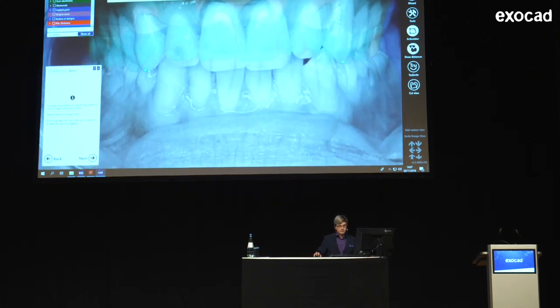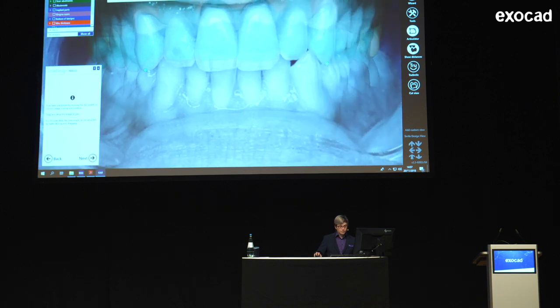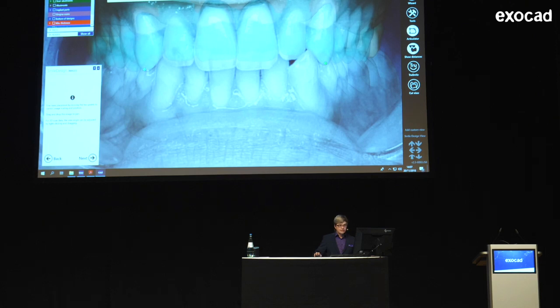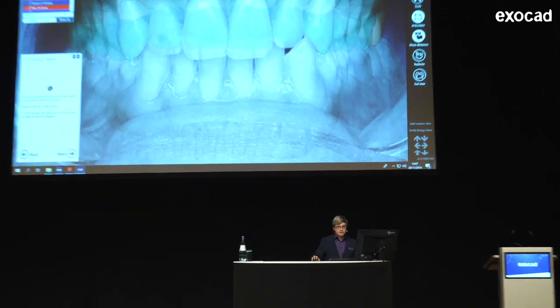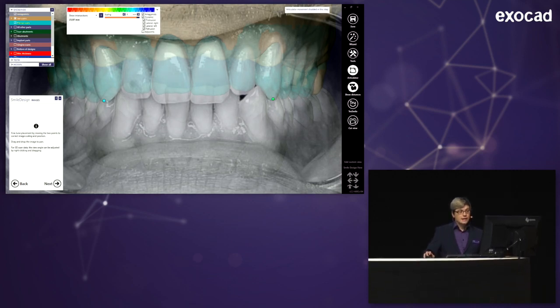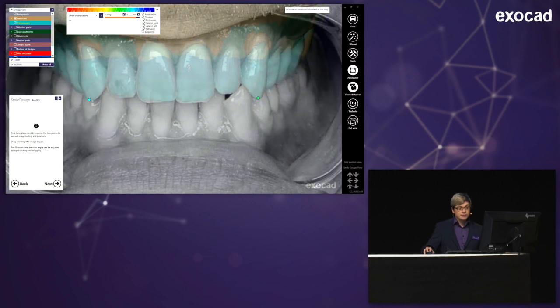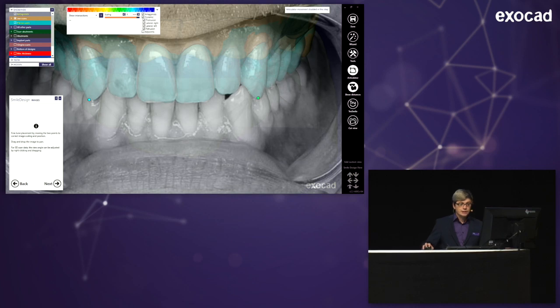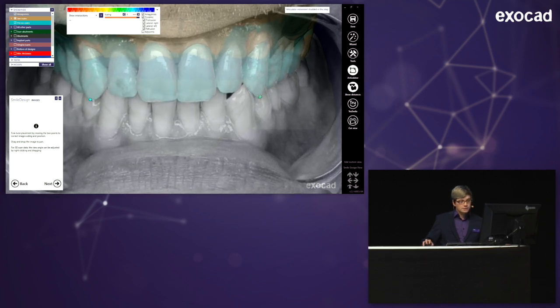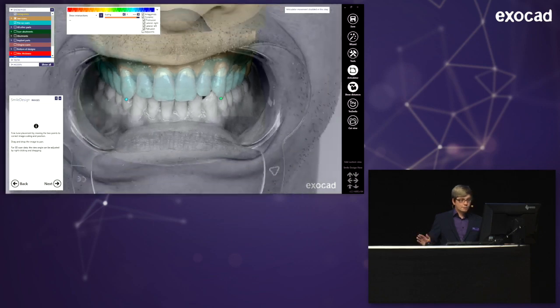You see the grayed out image moving when I move those points around. And I'm just trying to place them in a way that both of the canines are perfectly overlapping. But you already see here in the sides how the pre-op model is way lower than the teeth in the photo. And on the right click, I can actually rotate the model. Because in this case, the jaw is tilted in a direction. And you see here, now it's aligning a little bit better than before. I can still move those points around for those perfectionist fields. And if I'm happy with the outcome, I'm just pressing next.